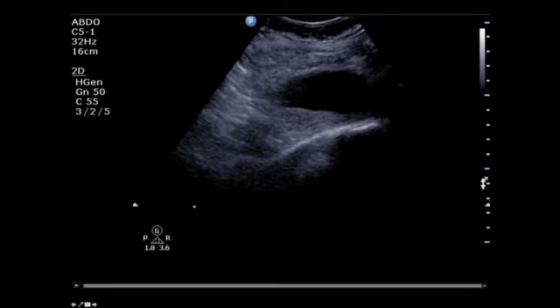So that's what a catheter balloon looks like in a big clot in the bladder. This is a small bladder diverticulum, and this is another catheter, a rounded balloon inside a bladder.